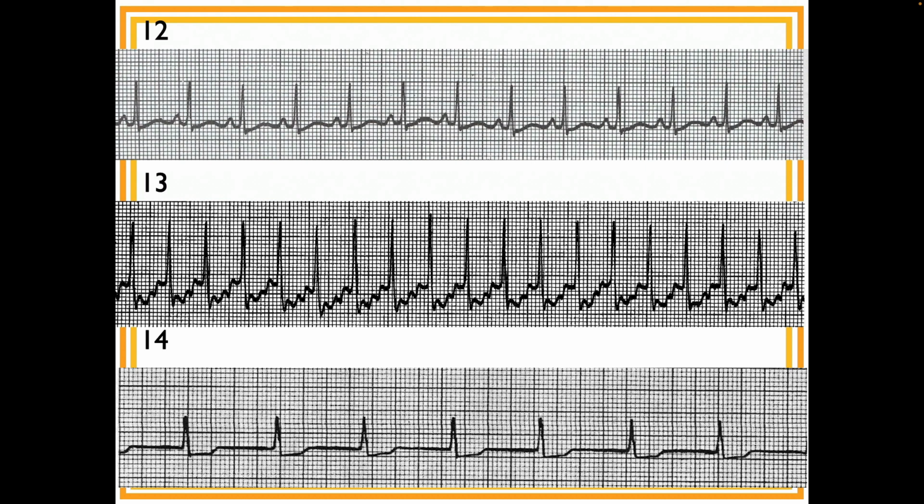Is it just sinus tach? Just sinus tach. Normal sinus rhythm, or sinus tach.